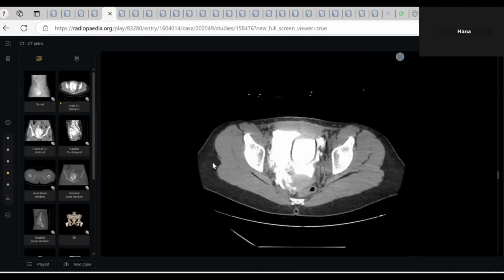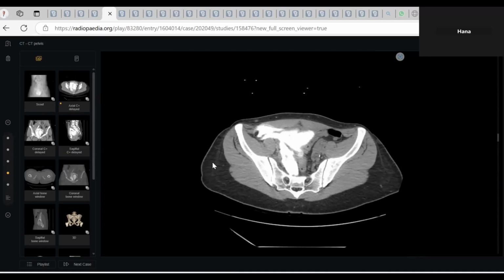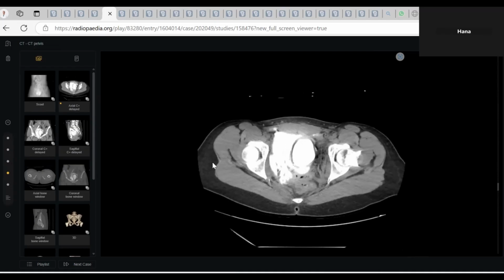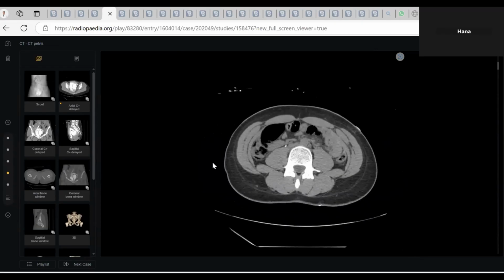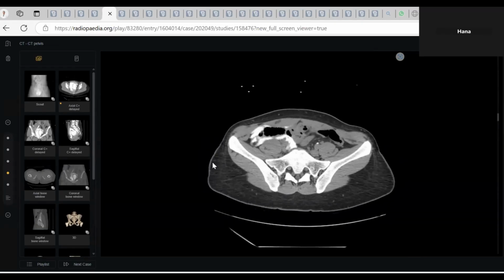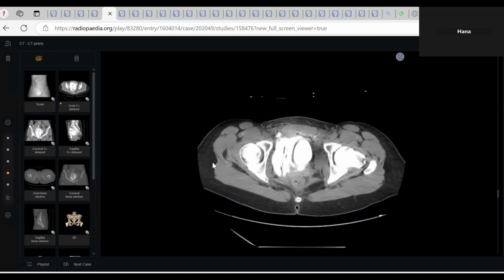This is a CT. Yes, the CT also confirms the findings. It shows the contrast outlining the bowel loops. So most likely we are dealing with an intraperitoneal type of bladder rupture, as it is not confined to the perineum, but extends upward. Give me a definite answer. Intraperitoneal bladder rupture. Okay, what's your management?